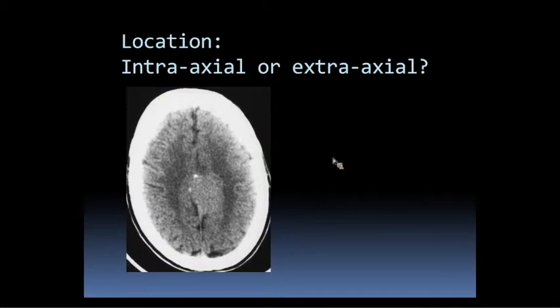So in this case, is this lesion intraaxial or extra-axial? What do we think? You guys can just shout out what you think.